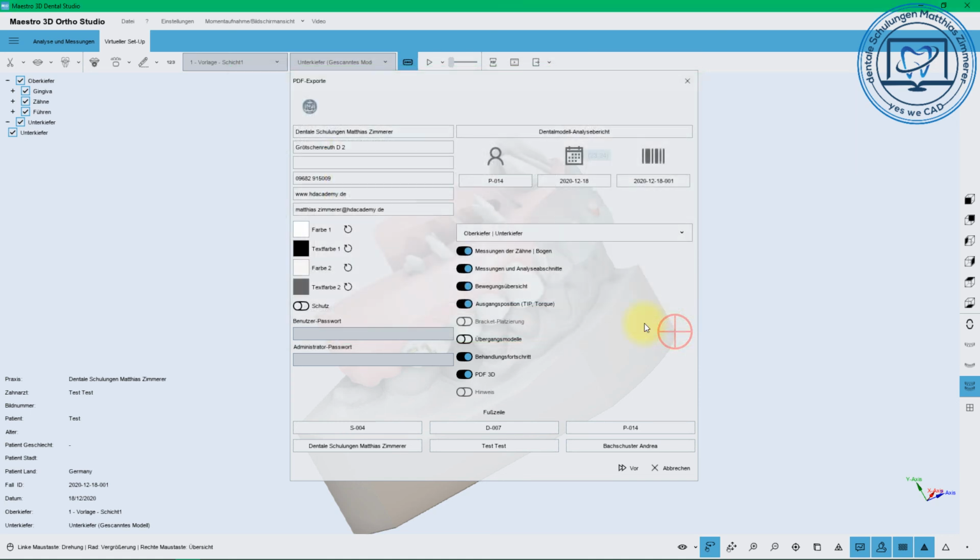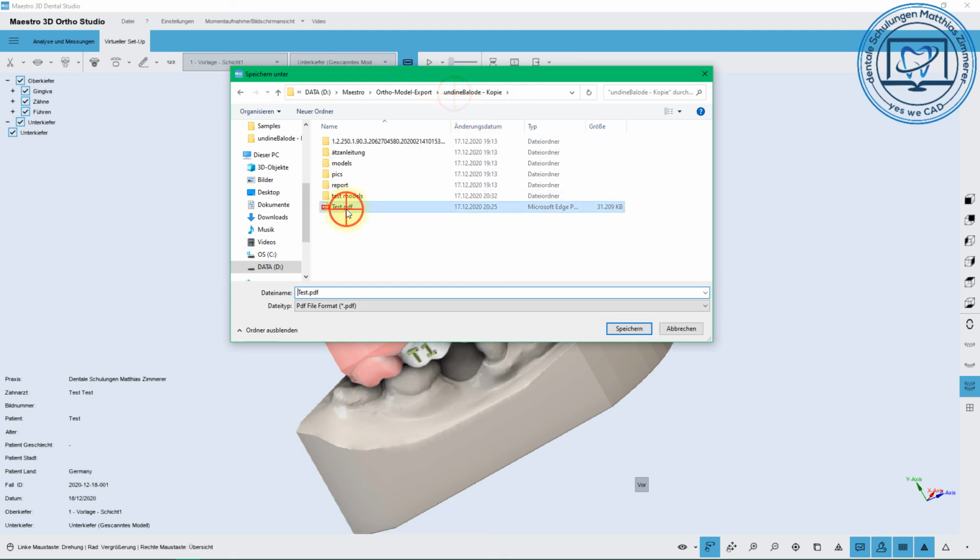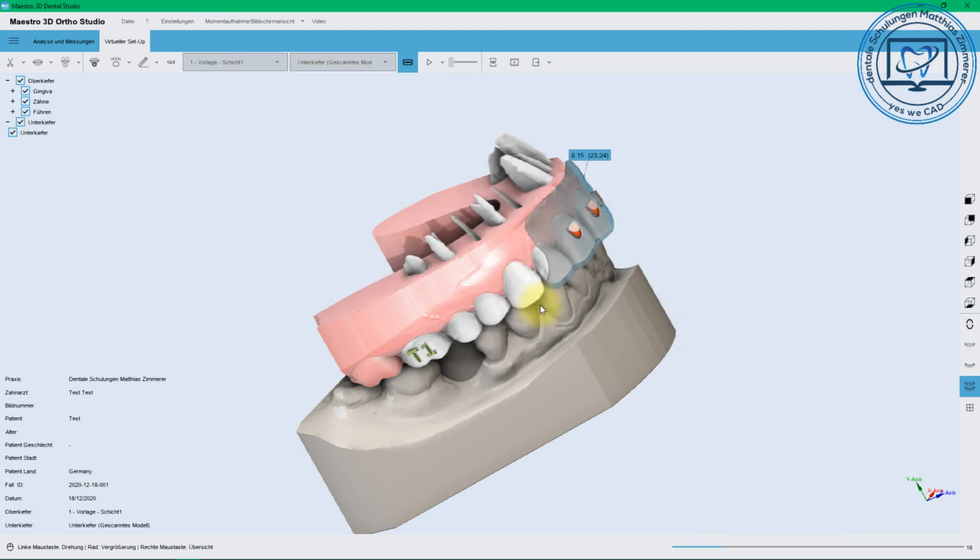You can adjust the report like you want. You can put in what you want. You can make the colors of it. You can have your logo on it. You can name it like you want. You can zip it. You can close it with a password. Just set up your export, and the software will tell you it's exported.